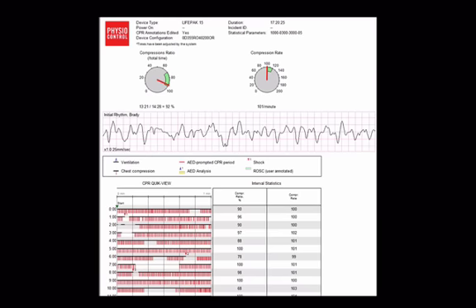At the top of the sheet, you will see two dials. What these give you is an average percentage of the total time that you are doing compressions. There's a goal of 70 to 95 or so percent, and the goal is to hit in the mid or upper part of that range. Obviously, the more time that you are doing compressions, the more time the patient is getting blood flow, and vice versa. However, there is kind of a too much of a good thing point. You do have to allow time for ventilation before there's an airway placed, and you do have to allow time for shocks and pulse checks.